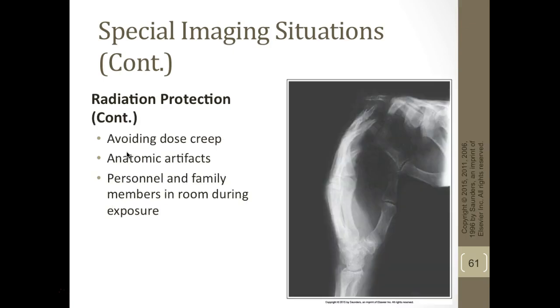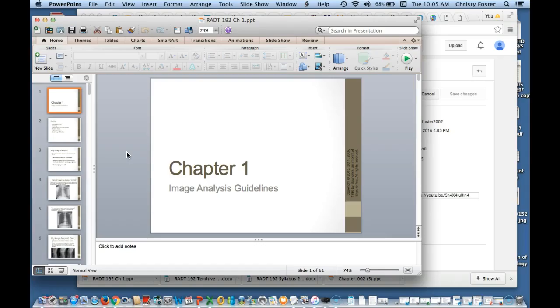Here, oh my gosh, so a lot of things wrong with this left hand here, lateral hand. So someone's taking their hand and trying to open up the other hand. So there should be a lead glove on that hand. There's no marker, there's no collimation. Very important that this doesn't happen. I hope I never see this. You can use sponges, sandbags, whatever is needed to help get that hand open, okay, without using someone else's hand.